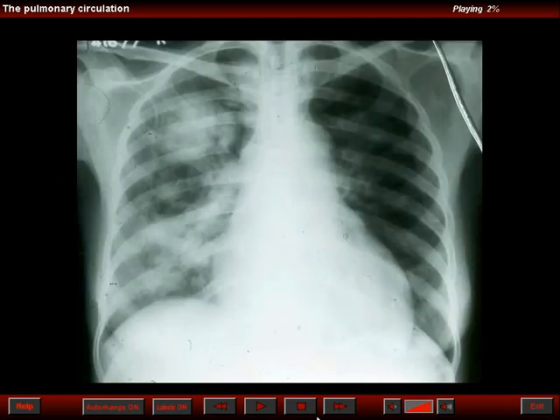In this patient, we see multiple densities throughout the right lung. Some are quite large and have the appearance of a pulmonary mass. What could this be? This could be multifocal pneumonias, could be infarcts of the right lung, less likely metastatic disease. Why are these densities considered to represent the pulmonary thromboembolism? Because of the appearance of the left lung. The left lung shows a total oligemia, and at the post-mortem examination, the right lung was riddled with infarcts.